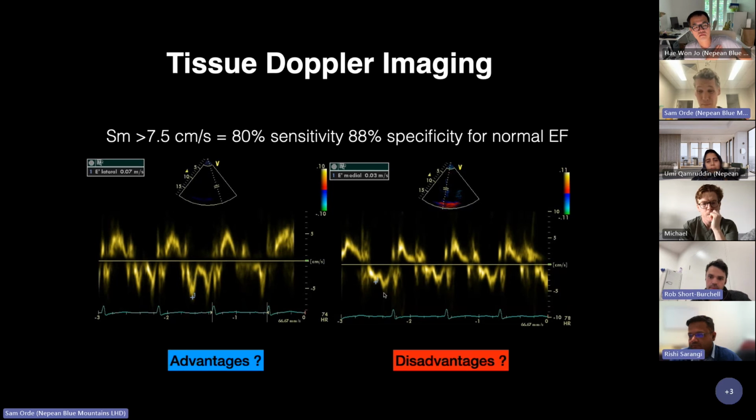Fantastic. Severe mitral annular calcification. It gets messed up when you've got junctional rhythms, or bundle branch blocks. And if you've got severe stenosis of the mitral valve, it messes it up. So you've got to use it in the right circumstances. Sinus rhythm obviously helps. Otherwise you've got to average over a ridiculous number of cardiac cycles.